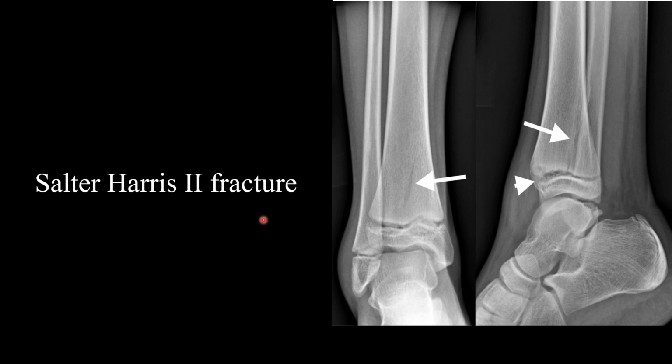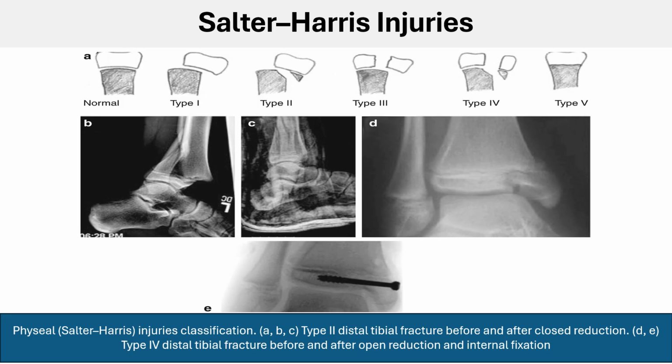Salter-Harris 2 fracture. I will go over the types of Salter-Harris fracture in the next two slides because it's extremely important. Know the classification of Salter-Harris injuries by heart. It is high yield, commonly tested in the board and also in real life encounters, very important to know.